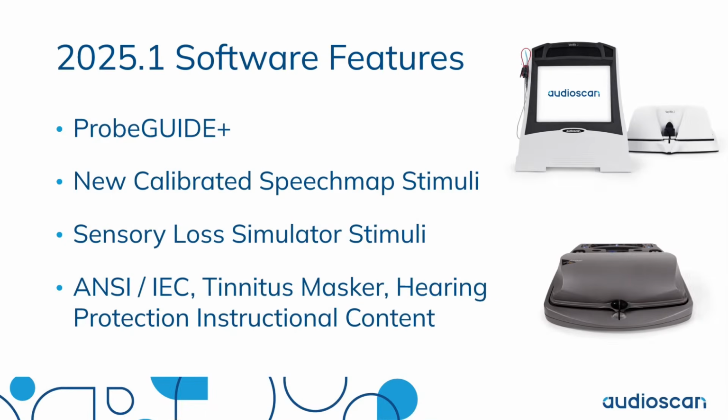Thank you for taking the time to learn about the new 2025.1 Audioscan software features. Full instructions are available in the updated Verifit2 and Axiom user guides.